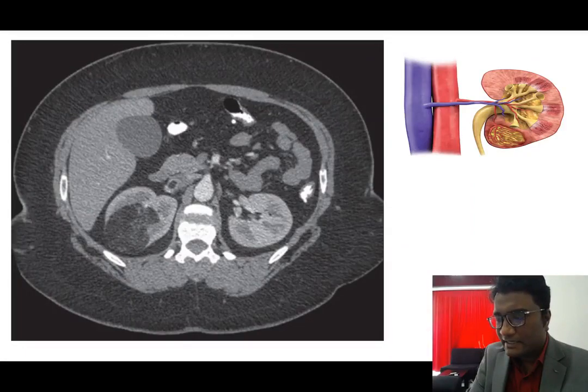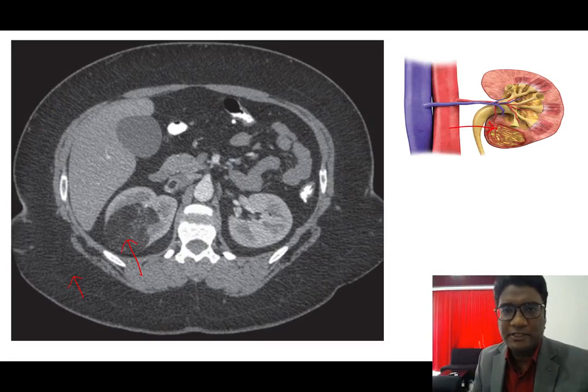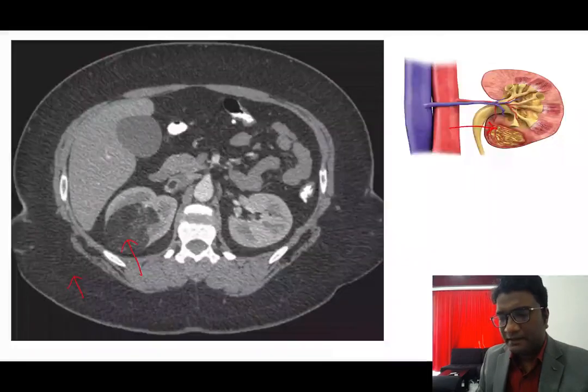Any fat containing lesion in the kidney, which is similar to the subcutaneous fat, look for angiomyolipoma. Strongly suspect angiomyolipoma, right?